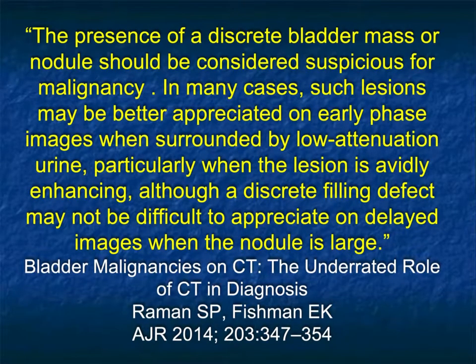Now, last time we left off part 3 speaking about bladder cancer, and we made the point that bladder cancer can be an incidental finding. When you're looking for the patient with hematuria, it does help you, particularly in older patients, to do arterial phase imaging from the diaphragm down to the symphysis, because then we have the kidneys as well as the bladder in arterial phase, which may help you pick up small lesions.